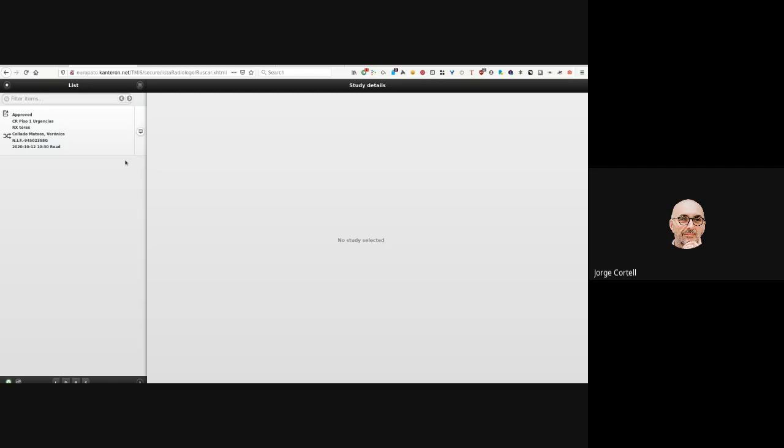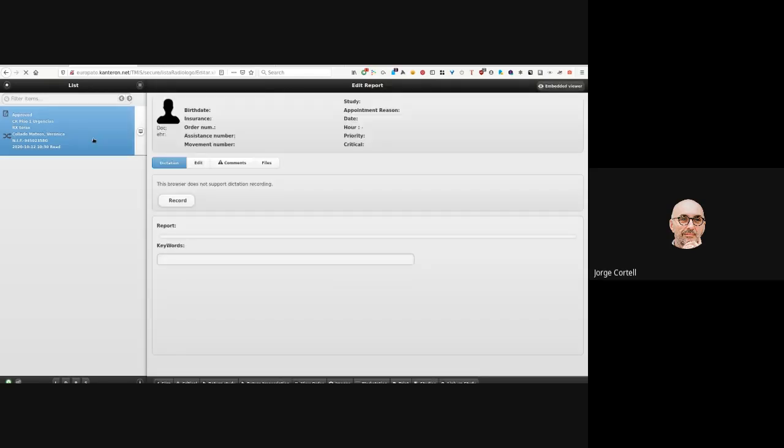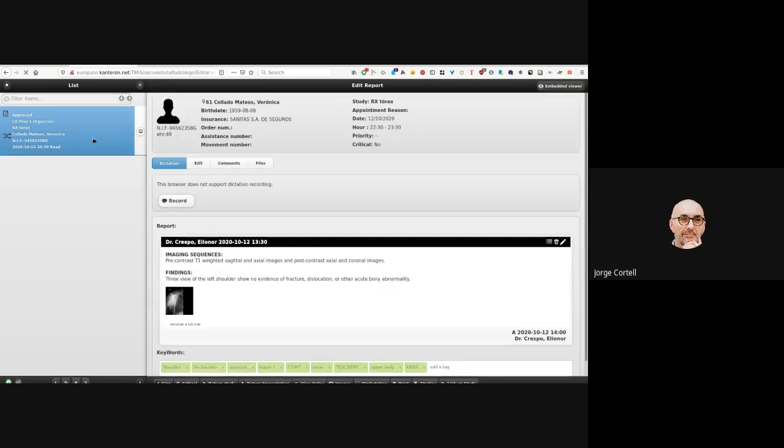There's only one thing in that list. Why? Because I have a filter. If I am the emergency radiologist, I only want to see emergency radiologists. I don't want to see prenatal ultrasounds. In the table, you see it because it shows everything. Then you can order it, but it still is there. It's thousands or even hundreds of thousands of studies there. Here, there's only one, or there's only 10, or whichever I need to pay attention to. So that's why we created this view.